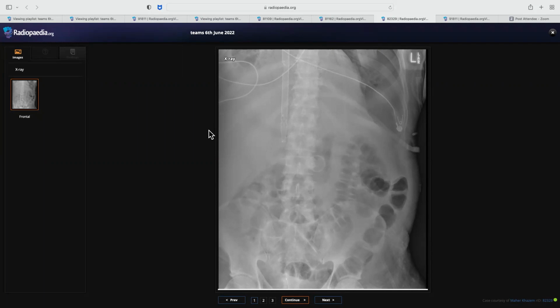The patient is breathless. Is there any clue for that on this radiograph? I'm not sure, but is this an IVC stent?